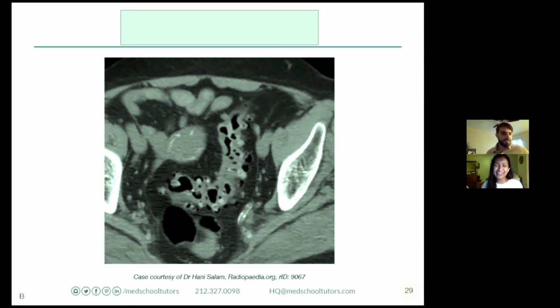Yeah, absolutely. So the nice thing about being lower in the pelvis is there isn't that much to look at. So here, we have the iliac bones, both iliac bones. This is probably the rectum, and it probably loops around with this here. So what we're looking at is actually the sigmoid colon, right? And all of this other stuff, we're just looking at small bowel, small bowel, small bowel, small bowel. And so here, when I'm looking at the sigmoid colon, there are a few things.